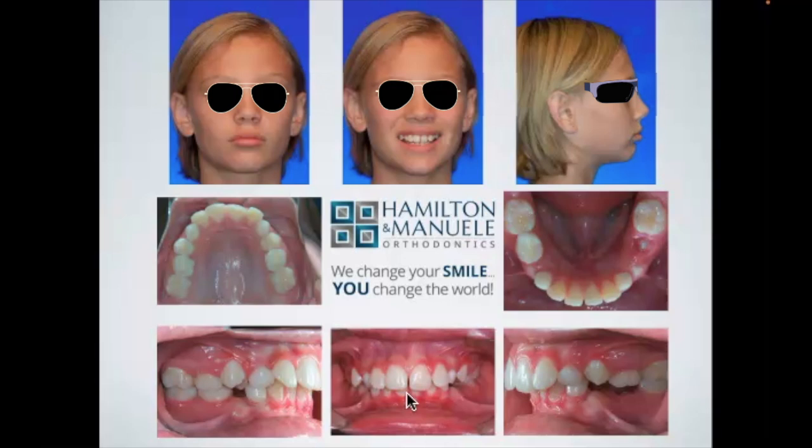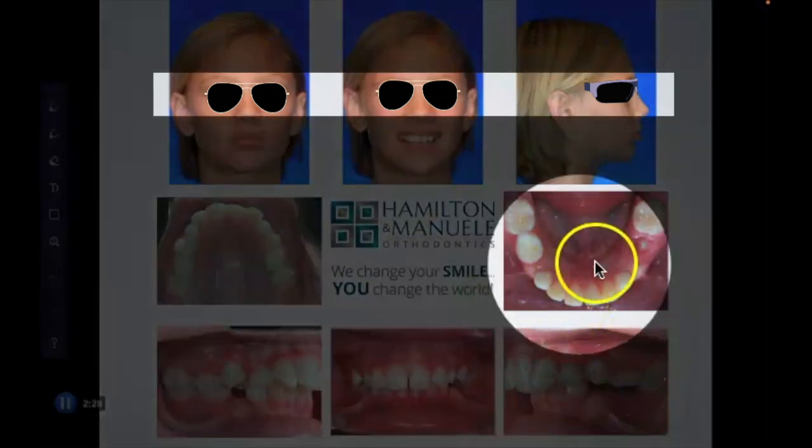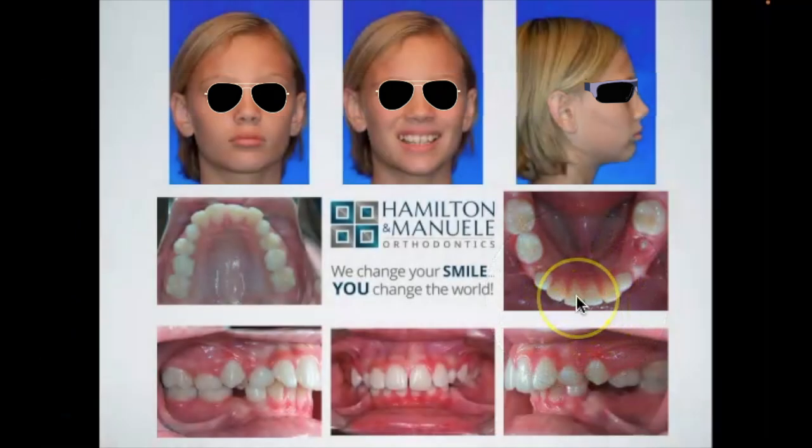So we look here, I don't have a center open photo here. Doesn't look too severe from the incisal edge here. A lot of times when you see that wear, it'll look thicker. But again, not the best images to see that, but you're going to look for it. If you see it, you're going to inform the patient, inform the parent, okay? That's something that matters to them.